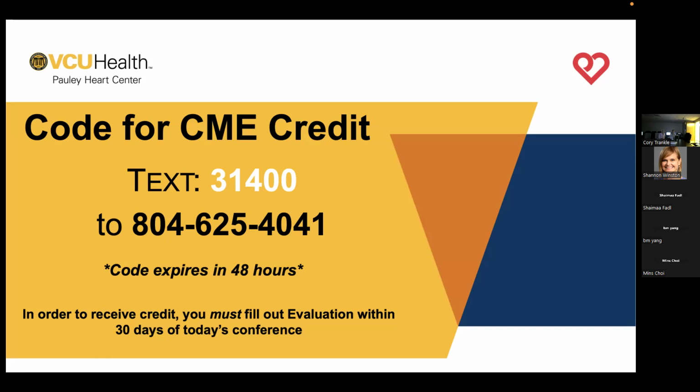Not to say that it looks like we have increasing, excuse me, loculation. Now, we had an echo about 3 or 4 weeks back, and that was negative for hemodynamic effect. I am not sure if that's the case now, because clearly the ventricles are becoming more and more hypoplastic, which means that there is a constrictive effect.